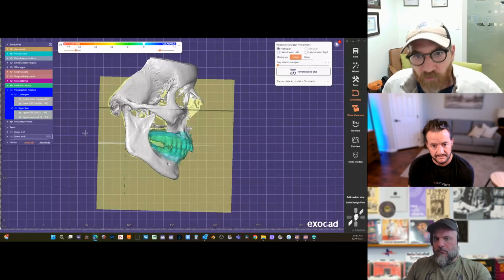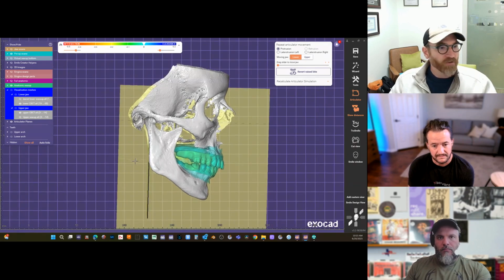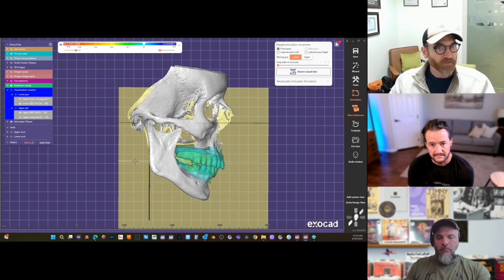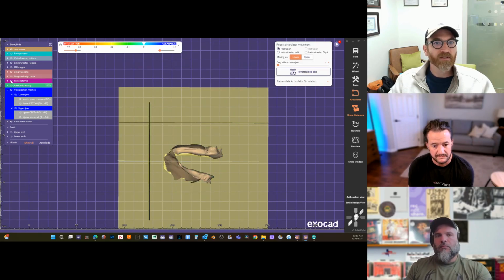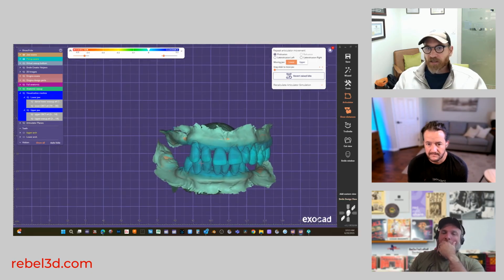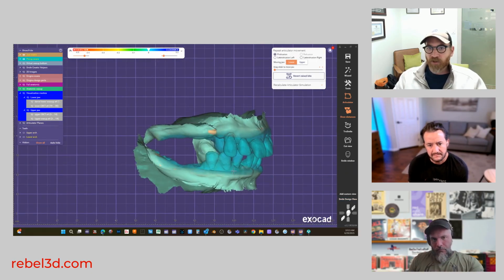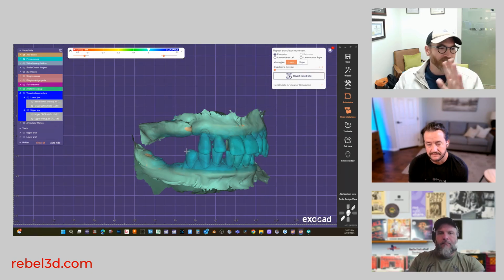Right. So what I do with every case, when I know I'm going to do a big full mouth rehab, is I start with pre-op scans, and let's get rid of all this stuff here. And then I agree with you, Daniel, that the amount of reduction here is just kind of arbitrary to make space for a wax up, but this is all done by bone.